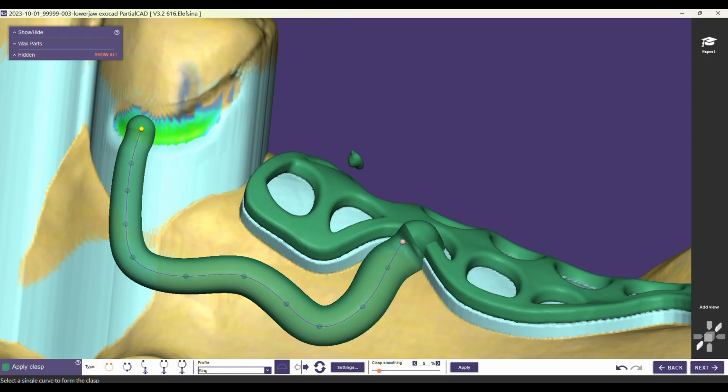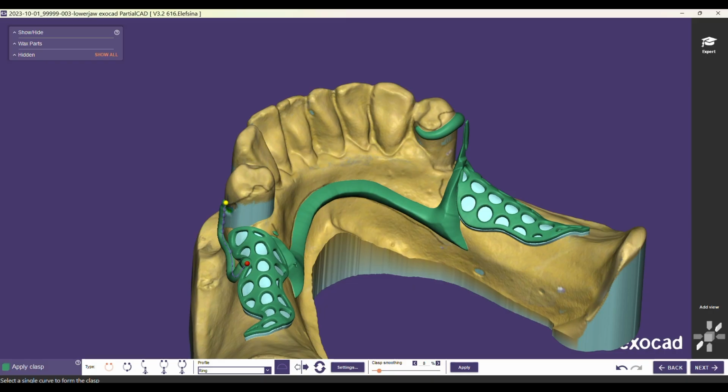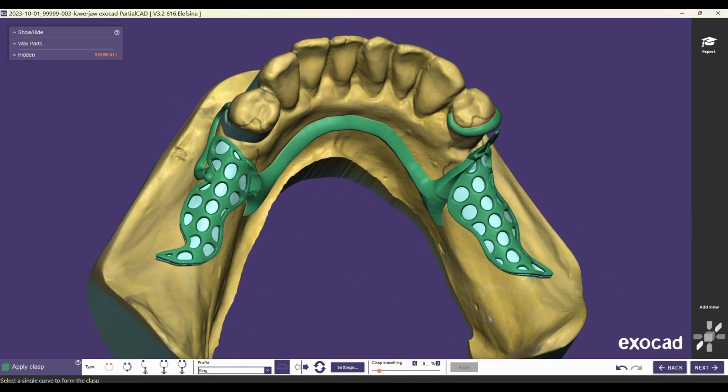I'm just going to thin down the clasp a little bit. Yes, 1.3 works. I don't like extremely bulky clasps. Clasps are better manufactured in a slightly thinner state. So I'm just going to blend this into this region and I'll smoothen it off later on.